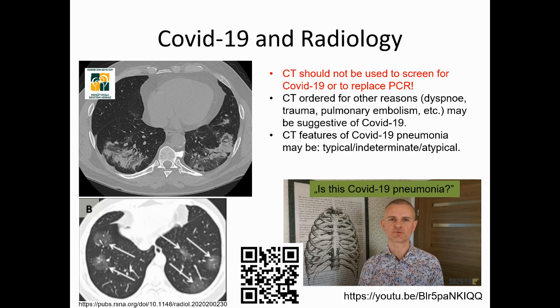However, on CT images that were ordered for other reasons like dyspnea, trauma, pulmonary embolism, etc., we might see classic signs of COVID-19 pneumonia.